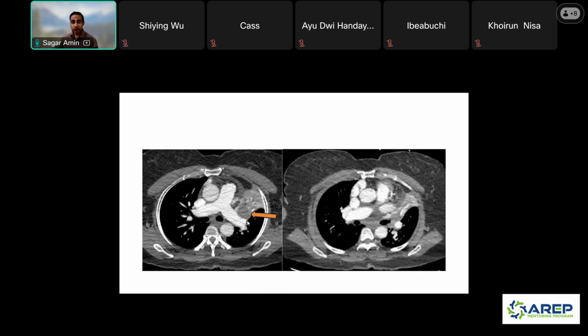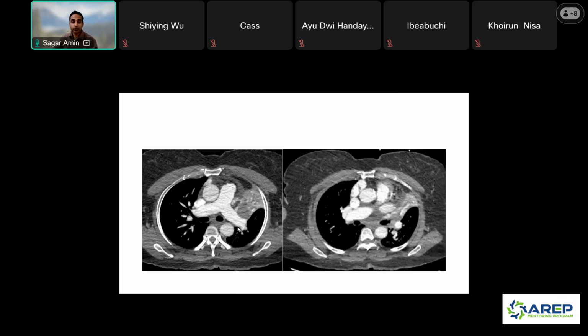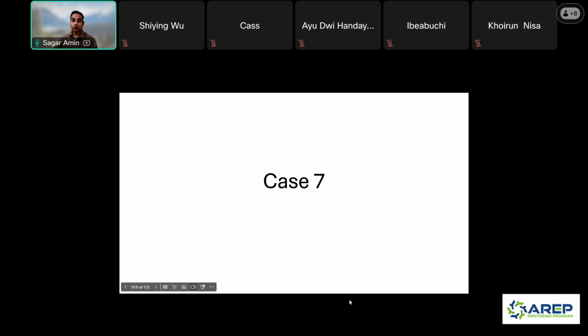In this case, there was an obstructive mass in the left upper lobe that caused the collapse. When we go back to the radiology findings, you'll notice this hyperlucency is from the hyperexpansion of that left lower lobe going around the aorta. And you'll notice here, it's going to be some of this air. If I had another image, you can see it tracking up towards that area along the distal aortic arch and the aortic knob area that causes that hyperlucency or air crescent radiographically. Good. Excellent. Okay, next case.